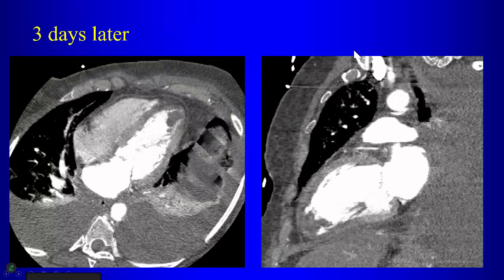This is 3 days later. So of course, 3 days later, the patient gets another CT. What's happened now? Filling defect of the left ventricular apex. Yeah, so now there's a filling defect here at the apex of the ventricle, right? So that represents a thrombus.